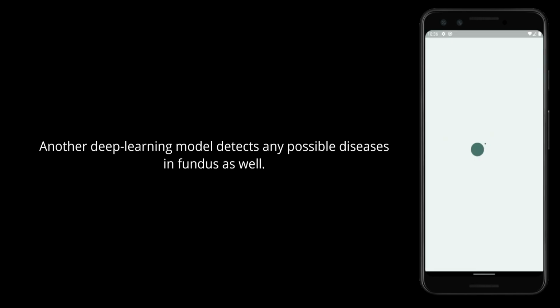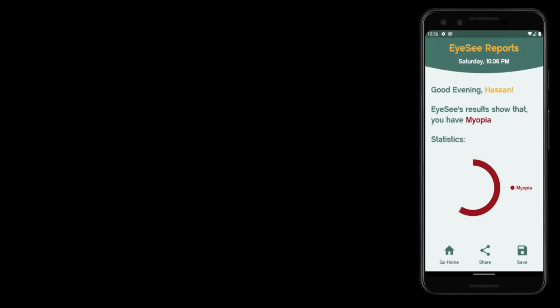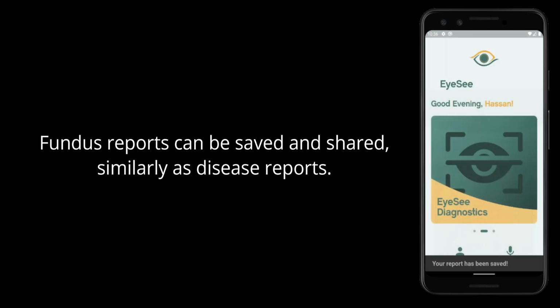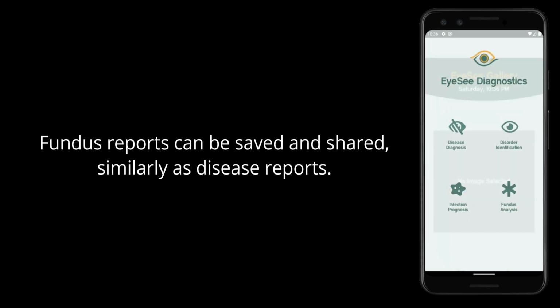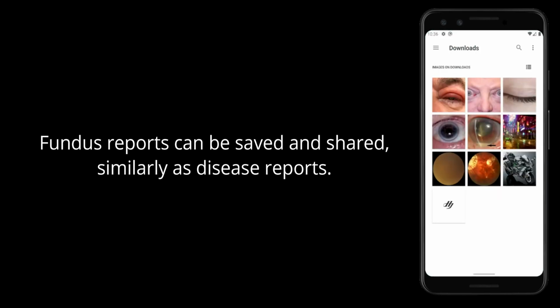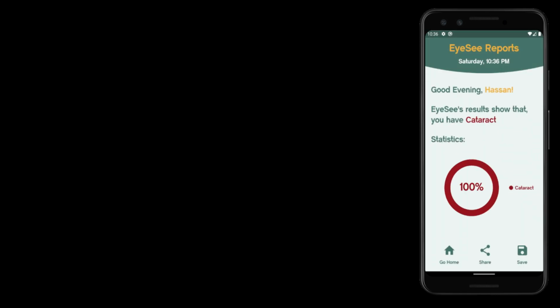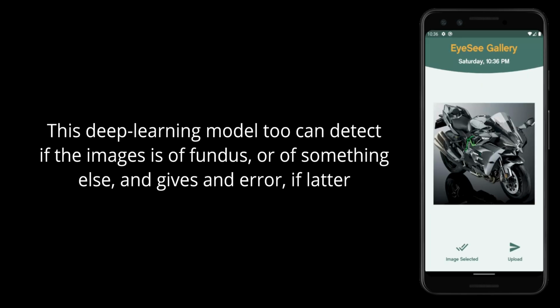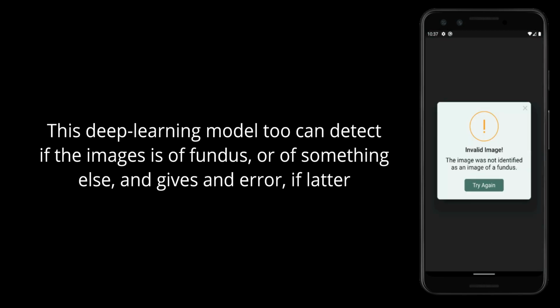Another deep learning model detects any possible diseases in Fundus as well. Fundus reports can be saved and shared, similarly as disease reports. This deep learning model too can detect if the image is of fundus, or of something else, and gives an error, if latter.